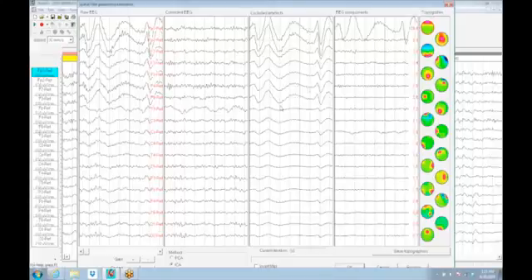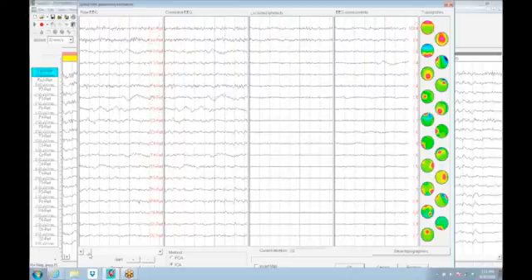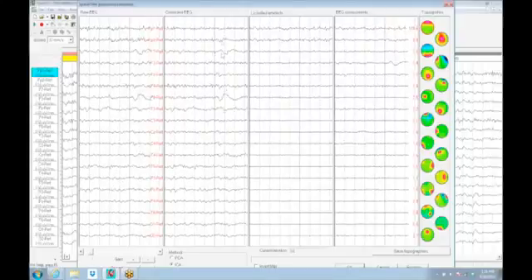And the ICA being extracted super cleans the EEG, even of the small saccadic eye movements, leaving the EEG minus the eye movements. Now, as you drop down, you'll notice that there's an F7, F8 opposite of each other as a display here in the topographies. This will be lateral eye movement. And if we scroll through the EEG to the point where we actually see a lateral eye movement, we'll probably be able to identify here F7, F8 going opposite of each other. And this is the lateral eye movement component, and it pulls out the lateral component.